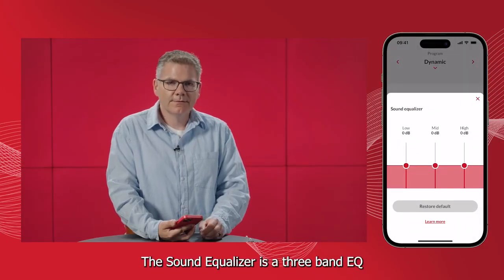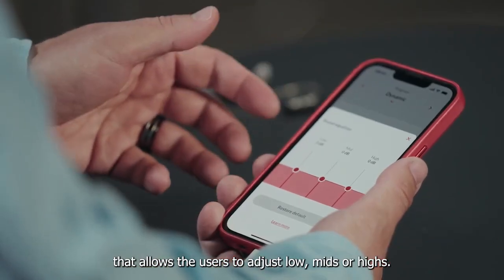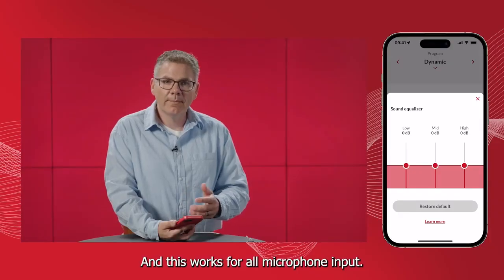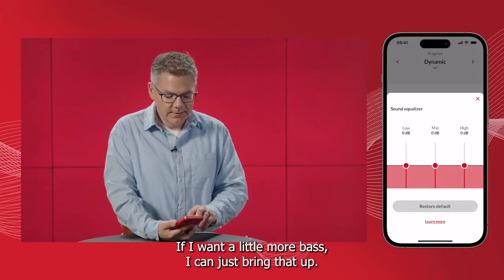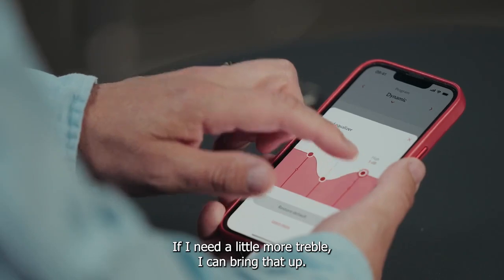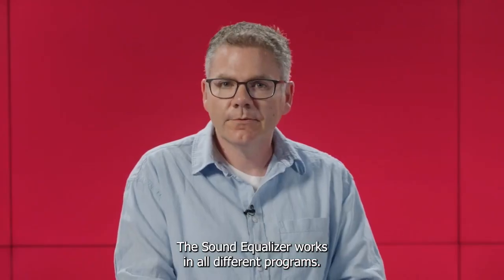The sound equalizer is a 3-band EQ that allows the users to adjust low, mids, or highs, and this works for all microphone input. If I want a little more bass, I can just bring that up. If I need a little more treble, I can bring that up. The sound equalizer works in all different programs.